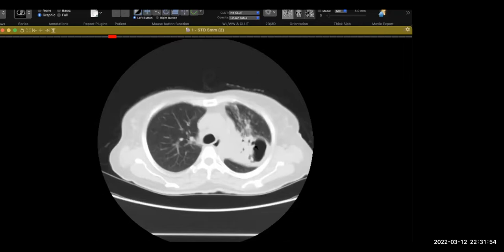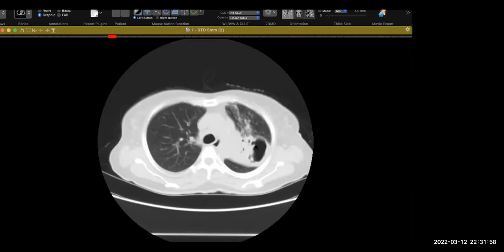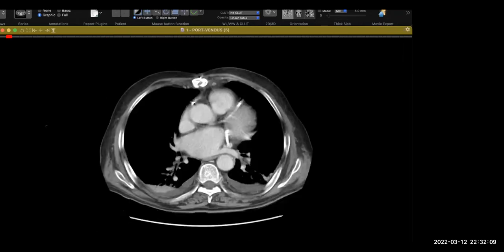given. So, what do you think? A fungal infection could be possible, or tubercular infection, maybe treated with routine antibiotics. So this is the next case.